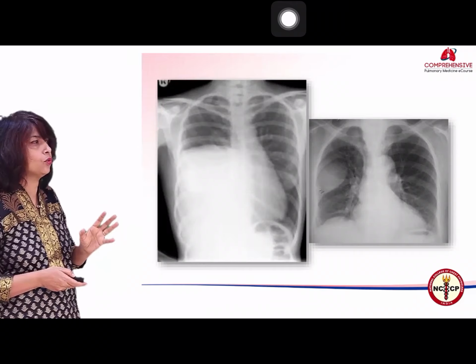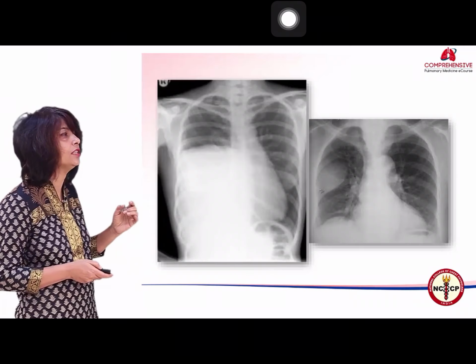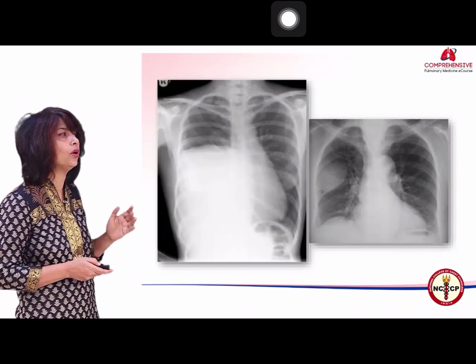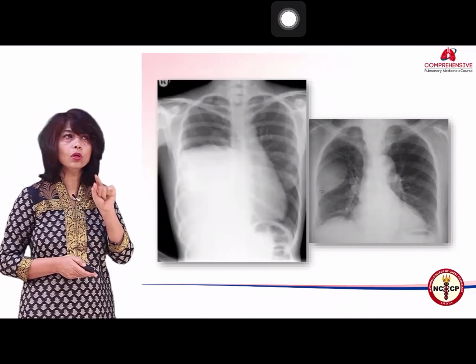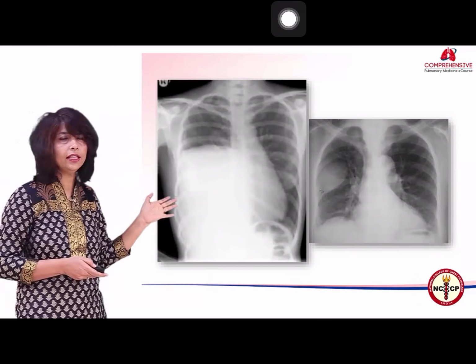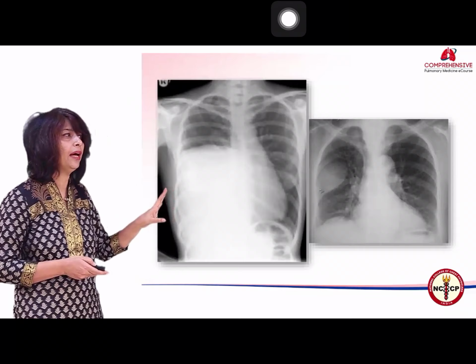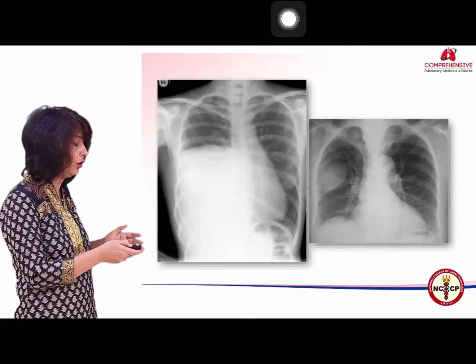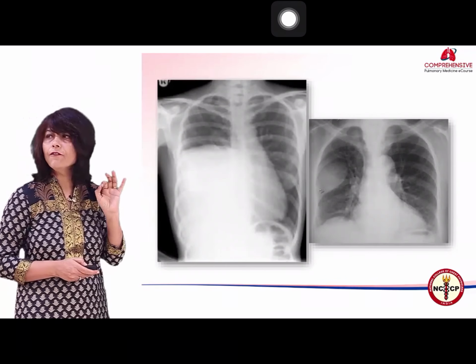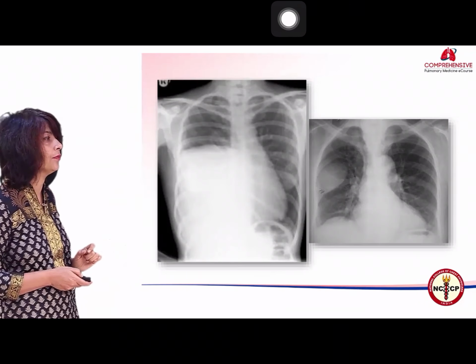The next radiograph shows you loculated fluid in the minor fissure. We will see more examples of these. So as I said, on the medial side, the angle sign still shows you acute angles. But can you see all the borders? In the parenchymal lesion, we said all borders should be visible, but I cannot see the lateral border. Can I differentiate it confidently from a peripherally placed parenchymal mass? No, I cannot. So you cannot always tell, but following the fact that one border is lost and the margins are very sharp, I tend to think that it is likely to be an extraparenchymal lesion.